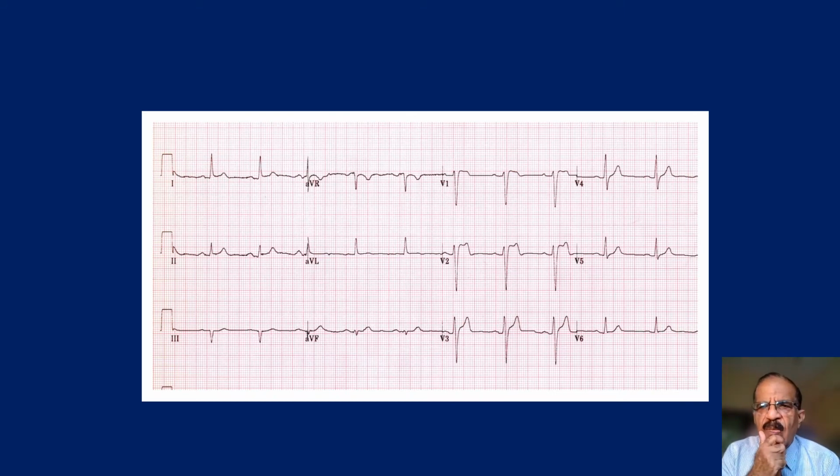This is even more rare. This is again seen in those families where there is a history of sudden death. It is supposedly not very rare, but not very well known. What do you see? Do you see any problem in this ECG?